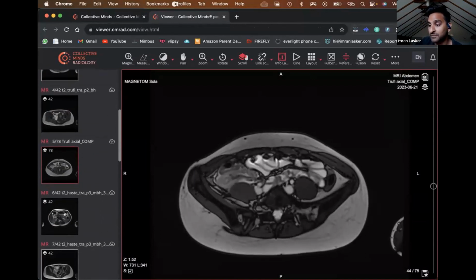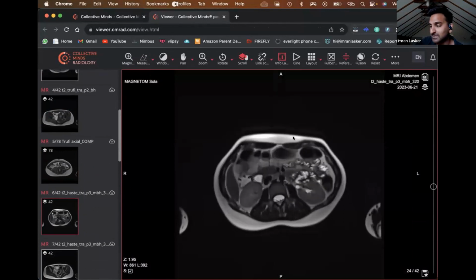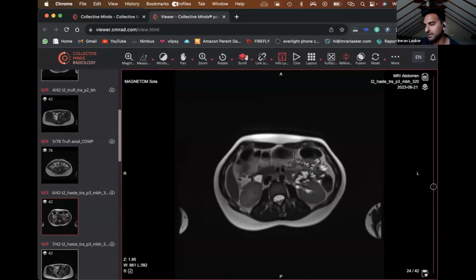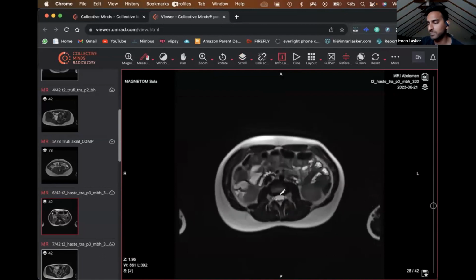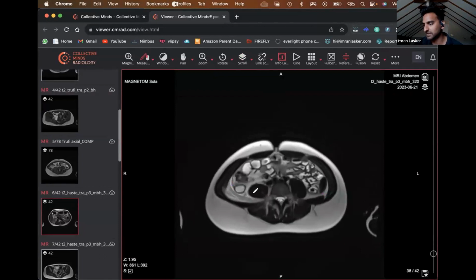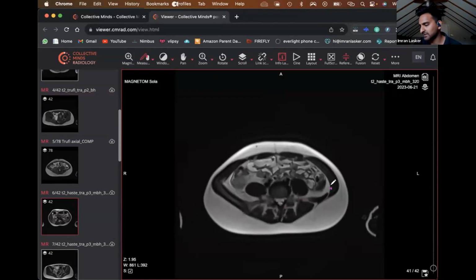And it turns out that on some occasions, it may be worth doing an MRI scan, especially if the patient is very young, looking for appendicitis. And if we just treat it like a CT scan, and I'll tell you a little bit about MRI, or bits of MRI that I understand anyway, if you look at the area over here, that's your spinal canal, right? And in that area, there's some spine that is very, very bright. So this is a T2 weighted image. Basically, fluid is going to be bright on this image, right? So as you come down to around this area, you can see that this is the fat here, but all this looks a bit strandy and looks a bit kind of bright, a little bit like that CSF fluid. Coming further down, it just doesn't look quite the same as the other side.